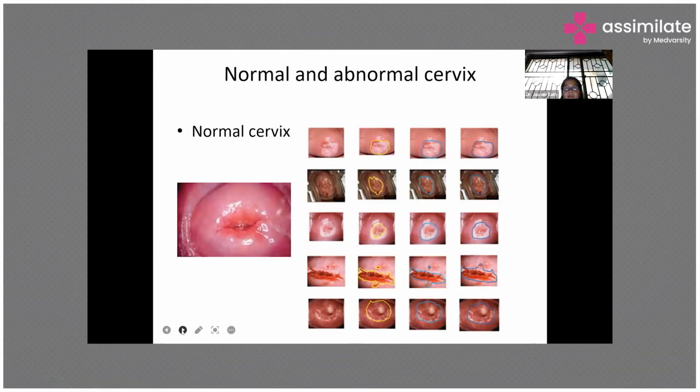This is a normal and abnormal cervix, which I was talking about. By this you can know what an abnormal cervix looks like. In the first few rows, you will see this whitening of the cervical lesions, which you can consider as an abnormal thing when we put acetic acid on it.